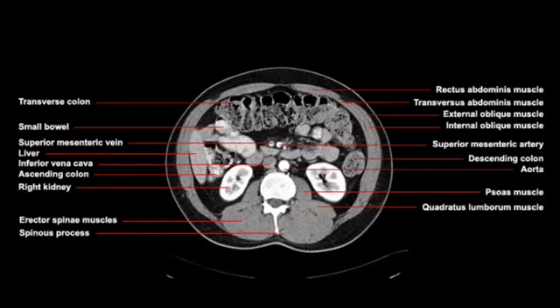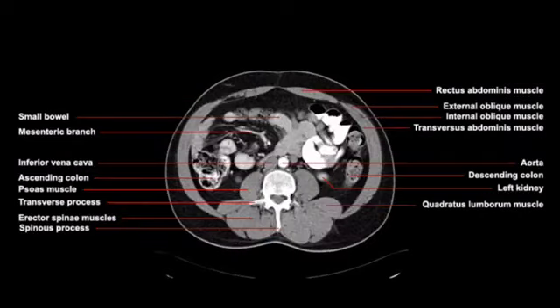There's also some important muscles that are very clearly seen here. These are called the Erector Spinae muscles. They're called the Erector Spinae muscles because they sit on the posterior side of the spine, and they help a person to stand erect. When you are leaning over and stretch out and erect yourself, the Erector Spinae muscles are largely responsible for that. This next image includes some of the same information and also some new information.